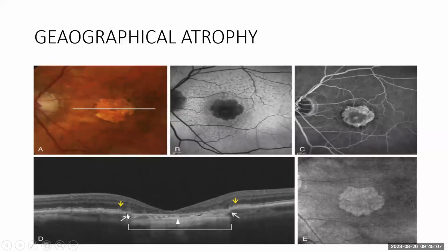And I'll point out something of interest that you should also look out for. There is an excessive hyperreflectivity in this place I'm pointing at. Now, see this region I'm pointing at, pointing downwards. It's because of the atrophy. It's called a reverse shadowing.